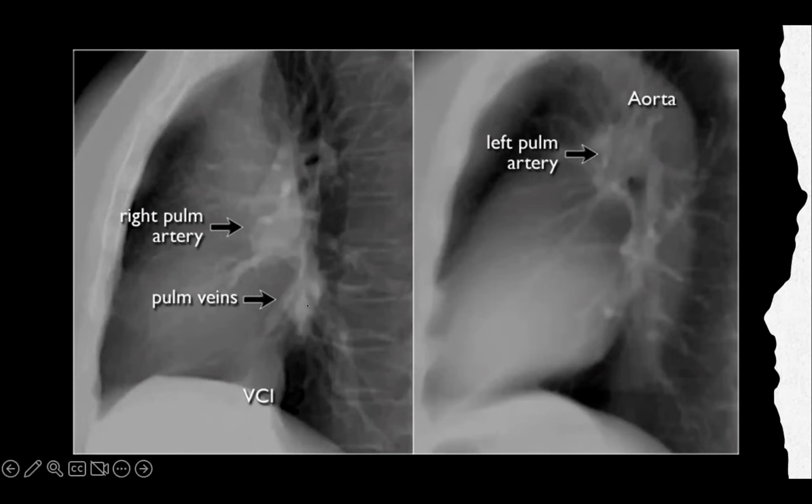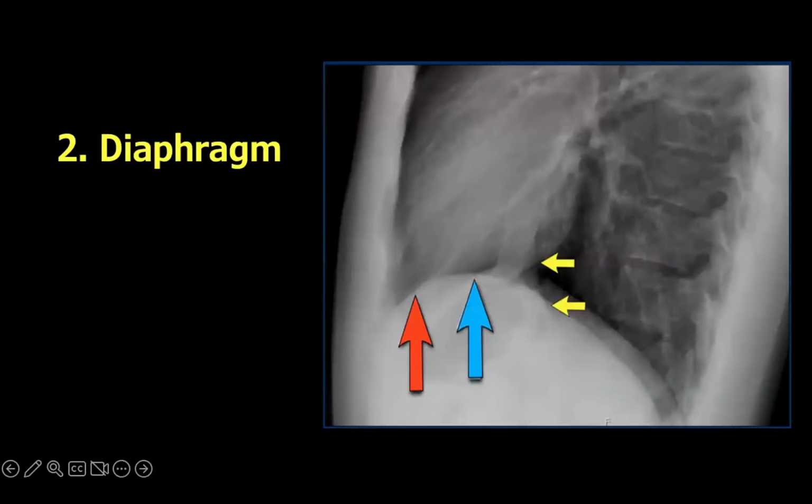But if you see this, I would rather call it an abnormality in the chest on the lateral chest radiograph, and I'll look at it in the frontal and, depending on the scenario, get a CT for that. That's not normal. This is a thick slab where you see the pulmonary veins projecting very well.